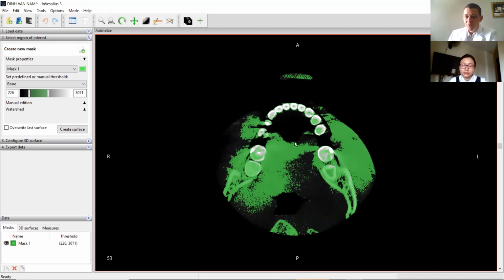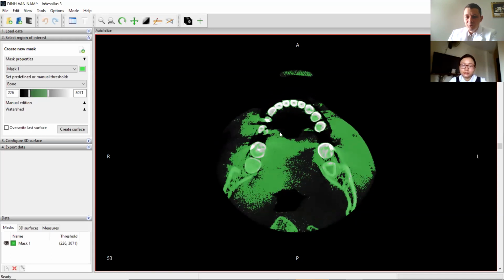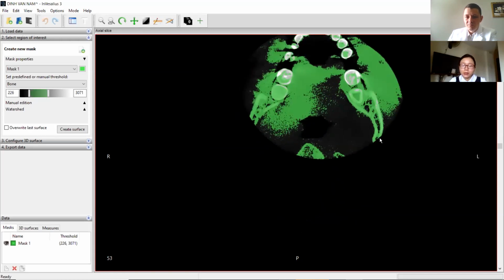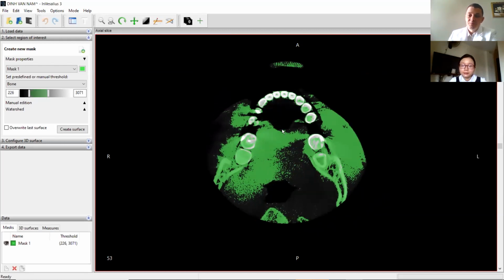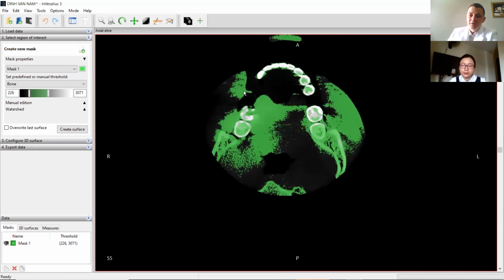If you click the middle button, you can move around like this. The left button, right? No, the middle button. This one, the one you can roll. You can roll, and if you click it, you can move like this also.